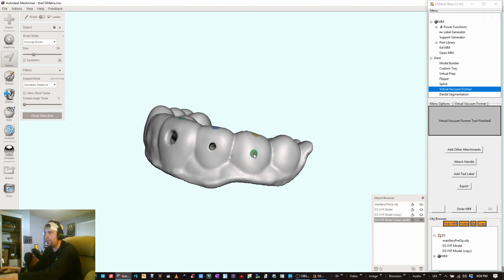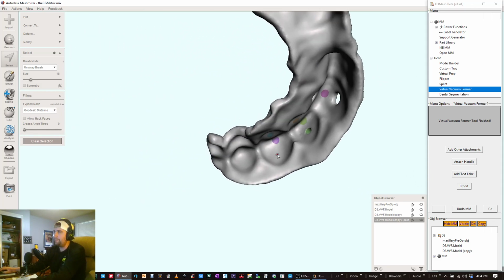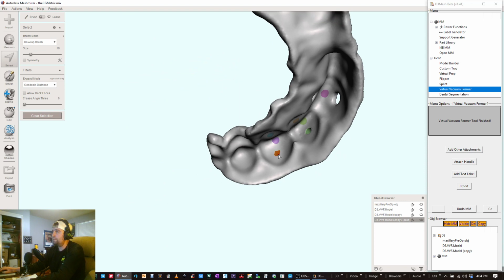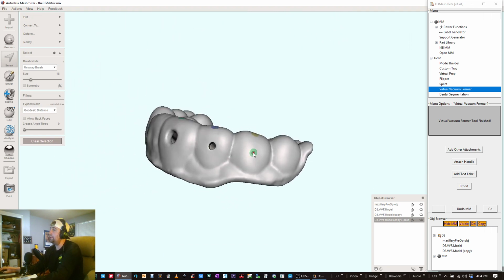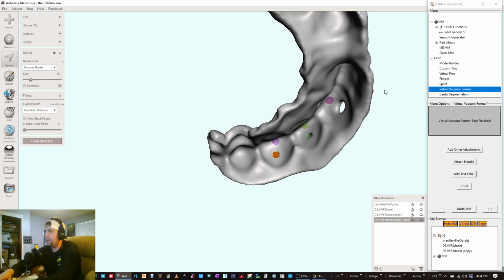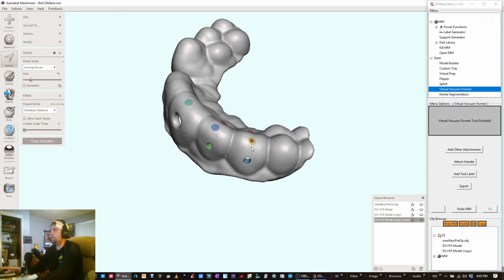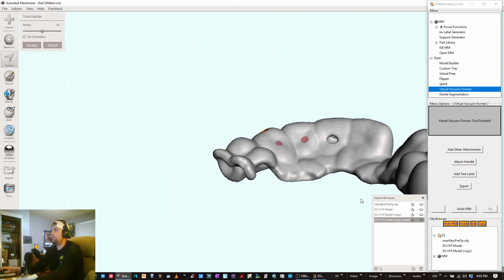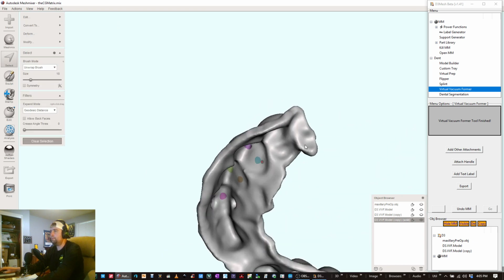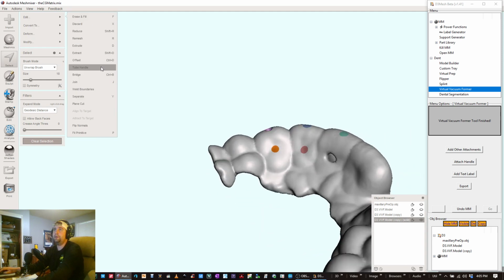start to choose these individually. I'm going to make my brush a little bit smaller. Double click on that one. Oh, look at that. It's the one I didn't do. Optimize, smooth boundary, enter. I have that one selected. It's a lot smaller, it looks like. So I'm going to expand that boundary. Okay. And then double click on this one. Tube. Got it. That one. And you can only do one tube at a time. Make sure I'm on the right one. Both selected, and tube.